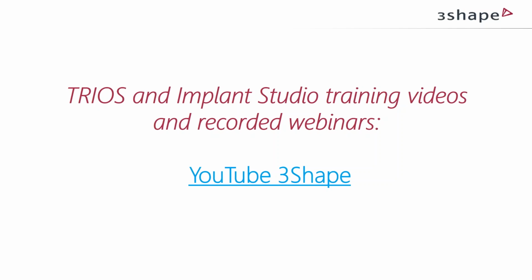Recommendation, the way it works today with Implant Studio is that we have, you can say, established integration with some 3D printers in there, and we are of course working on expanding that integration. And to mention a few, then the integration today consists of printers from different manufacturers, so that is both EnvisionTEC, Stratasys, EOS, and many others that I can't just name drop because it's too long since I've seen the list.